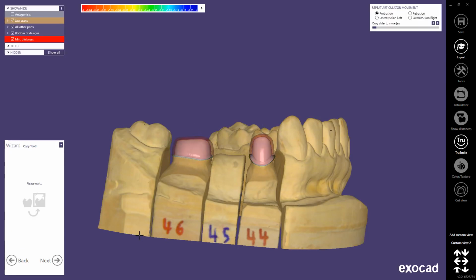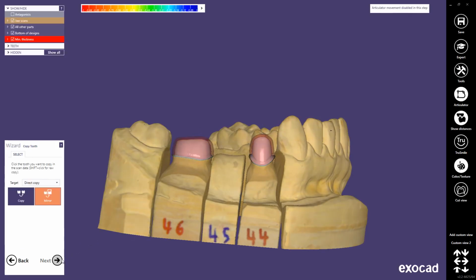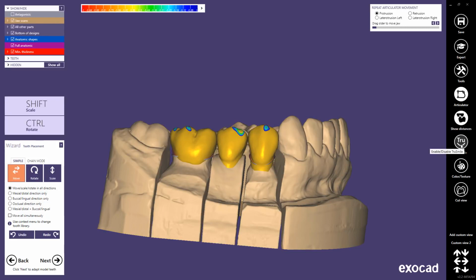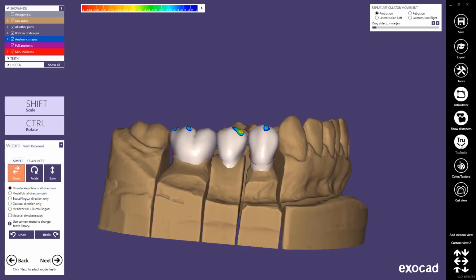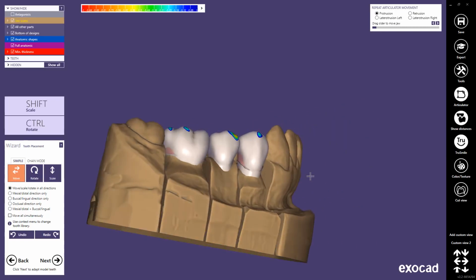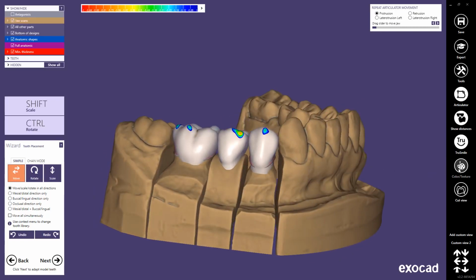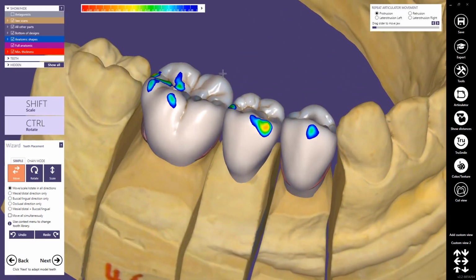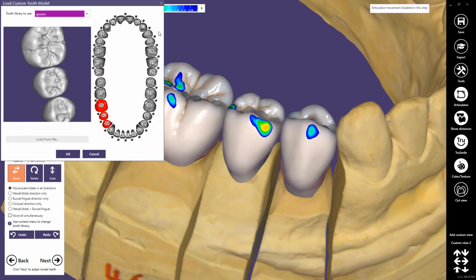In the Valletta release, the Copy Tooth step now starts with Direct Copy as target instead of Virtual Pre-op. You will find more information about this wizard step in a separate tutorial. The True Smile rendering for non-textured scans has been improved as well to make the scans look more realistic. A new HD tooth library is included in the new release with higher resolution meshes for maximum detail.